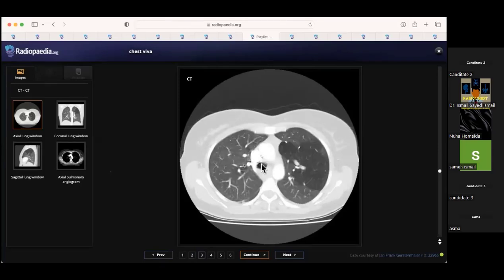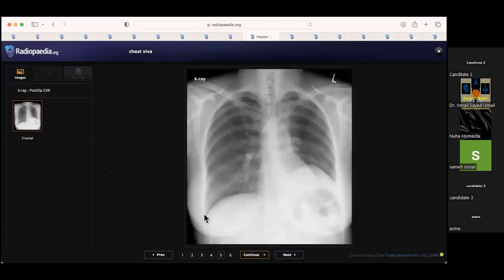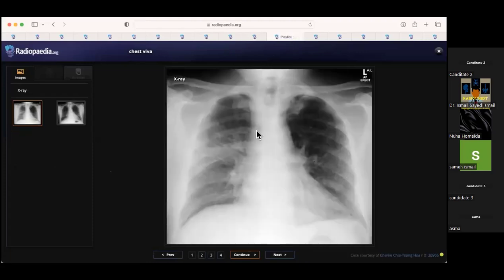So this is just a case of bronchial atresia, and this is just nuclear medicine. The patient here had surgery. So how do they treat them? Because these areas are prone to repeated infections, they tend to do a lobectomy. This patient underwent a lobectomy. We can see the clips, and we can see the reduced volume by tenting of the diaphragm. Okay, so that's bronchial atresia.